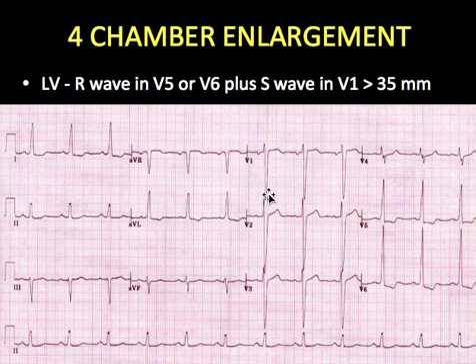So this is a deep S wave, lead V1, and this is a tall R wave in V6. Now we will take the R in V6, we can take anyone, V5 or V6. So R wave in V6, that's how many boxes? 1, 2, 3, 4, 5, 6, just more than 6 boxes. So we'll take it 6 boxes, 6 large boxes. That's about 30 mm. 5 into 6, one large box is 5 small boxes. So this height is about 30 millimeters.